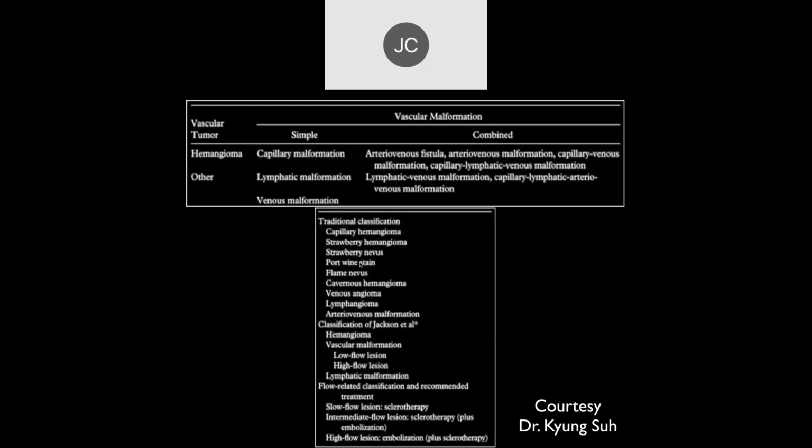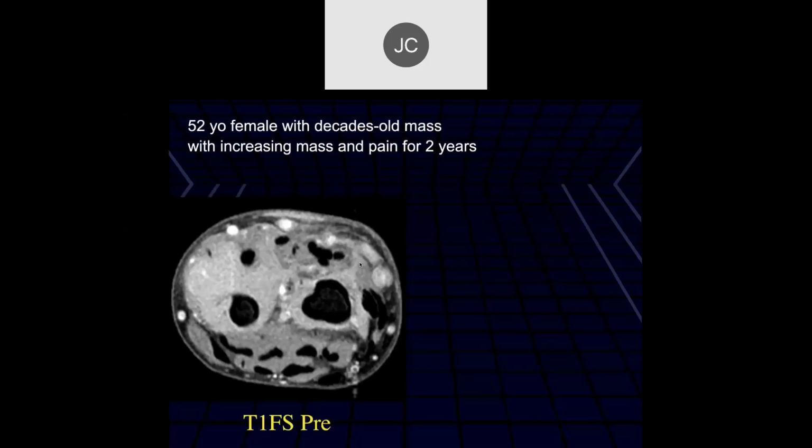Okay. And again, just gotta categorize these different kinds of vascular malformations.